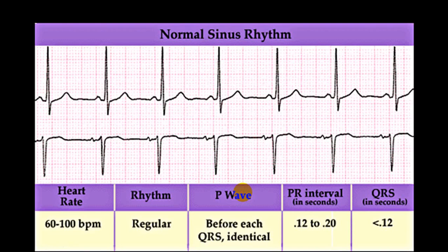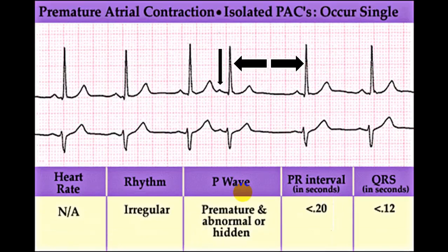You can see this is a normal sinus rhythm. There is no ectopic beat. Now you can see here there is an ectopic beat. This is premature. You can see this is the RR interval. The next beat should have come somewhere here, but it does not come at that time. It comes a little early, and there is a P wave. So this is an atrial premature beat. Because there is an atrial contraction, you will have a pulse. This will be with a little less volume, followed by a compensatory pause, and the next pulse will be of good volume. As this produces apex as well as pulse, there is no apex pulse deficit. This is a characteristic of an atrial premature beat.